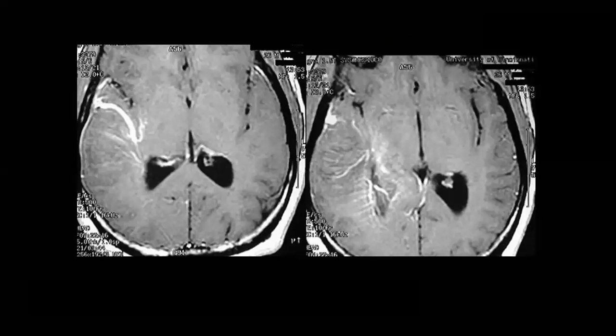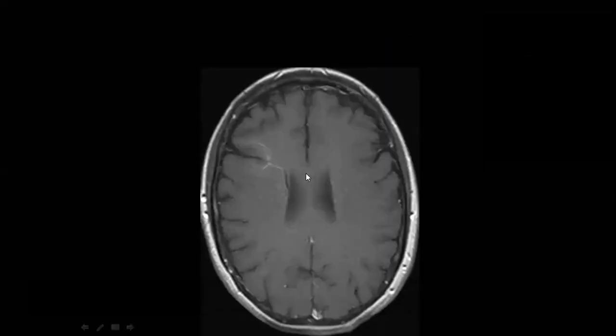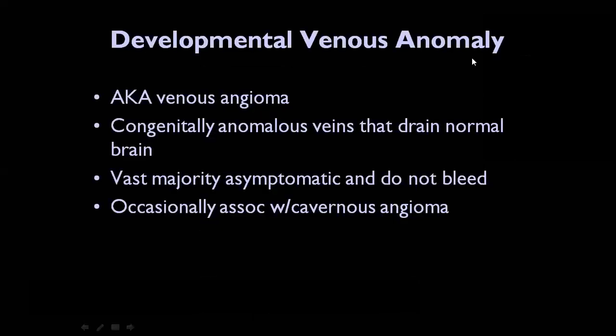This patient has this appearance. Most of us like this lovely appearance with this line, and this line, which comes to say to you DVA, developmental venous anomaly. When you find this line in the image, it is saying to you, please, this is a DVA, okay?